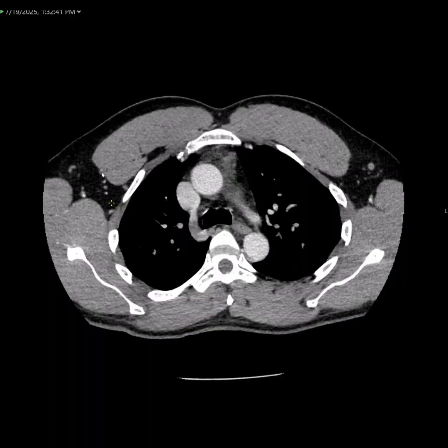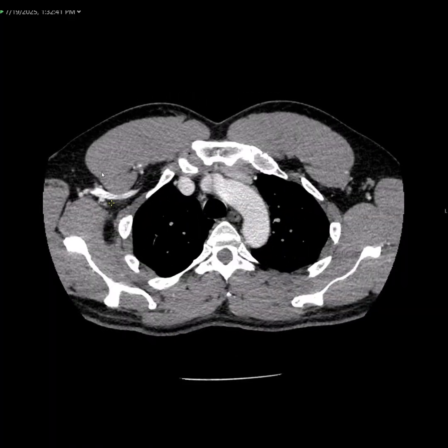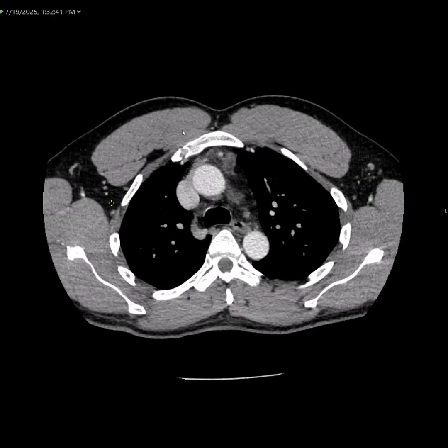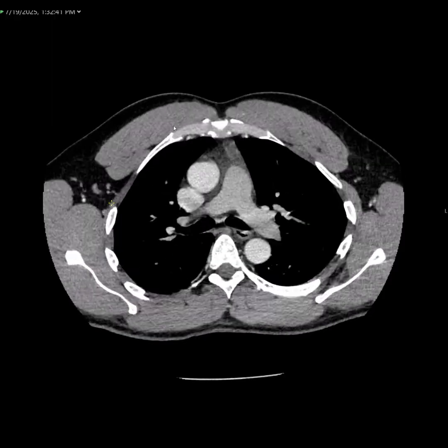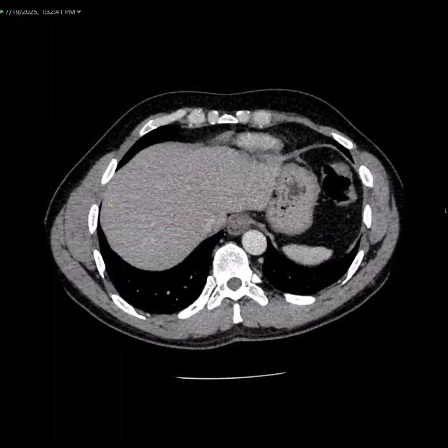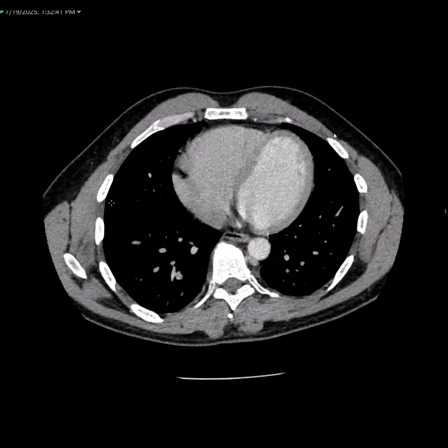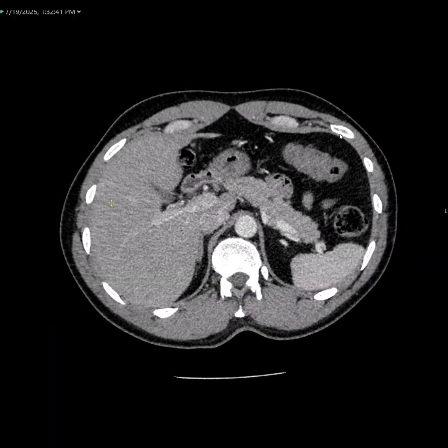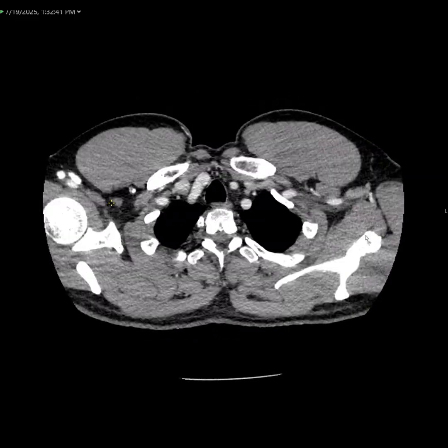After looking at the axilla, you want to work your way along the chest wall, both looking at the musculature and the subcutaneous tissue. Just working your way around the chest, up and down, again, breaking it into manageable chunks, examining one section at a time. Primarily looking for any sorts of masses, any edema, emphysema in the subcutaneous tissue, any fat stranding.